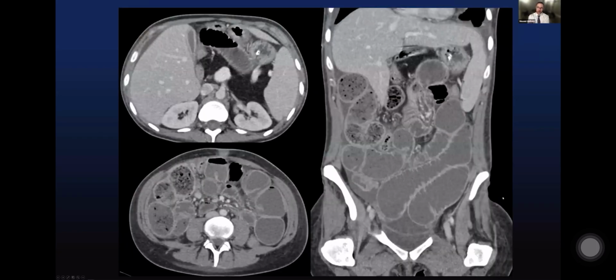This is a similar look too. This patient has mottled material within the small bowel, sort of at the site of the small bowel obstruction. But the clue here is this patient's fatty replaced pancreas. So rather than having a mechanical obstruction from something like an adhesion or an internal hernia, this patient has an intrinsic obstruction due to the bowel contents. This is meconium ileus equivalent or distal intestinal obstruction syndrome.